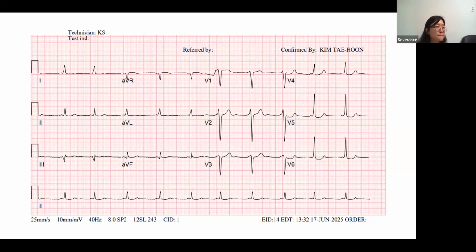In some patients, cardiac rotation and a vertical heart show a slightly different precordial transition. So I could not exclude a potential septal bypass tract.